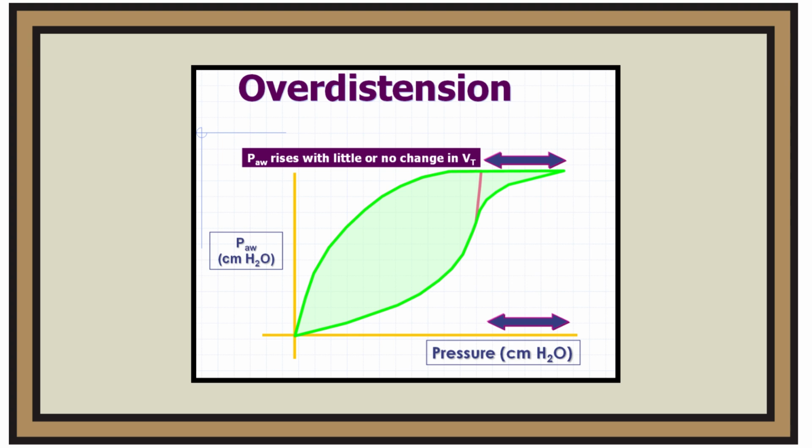Alveolar overdistension is a common observation made during ventilation of patients with ARDS. On a volume-targeted mode, alveolar overdistension is detected in these patients. The classic sign, known as beak effect or duck bill, shows an increase in airway pressure without any appreciable increase in volume. A switch to pressure-targeted ventilation at an appropriate safe pressure level or a reduction in tidal volume is indicated.